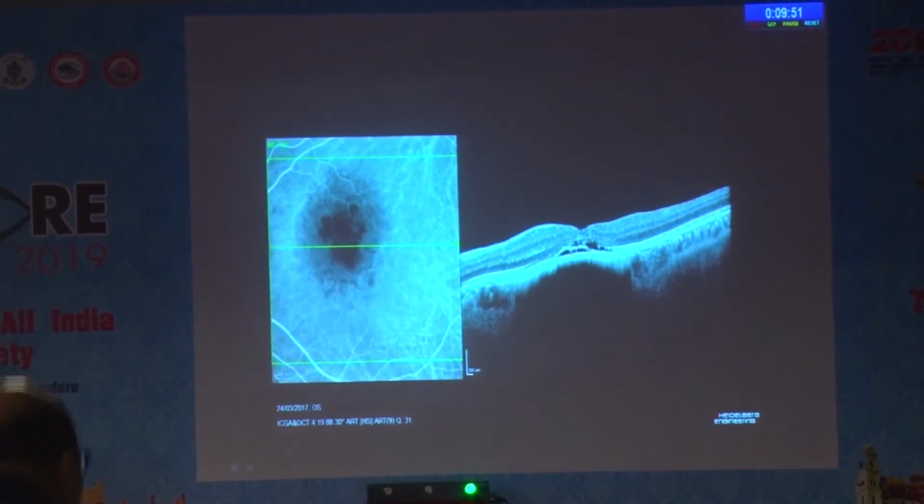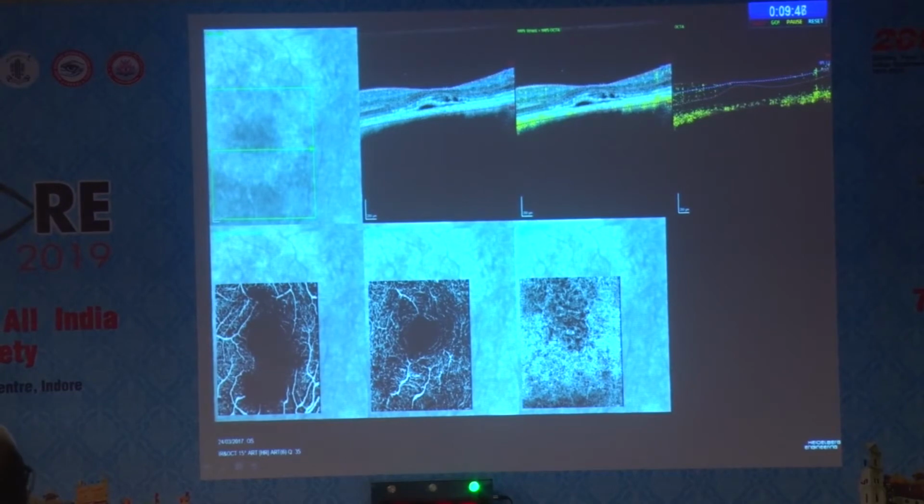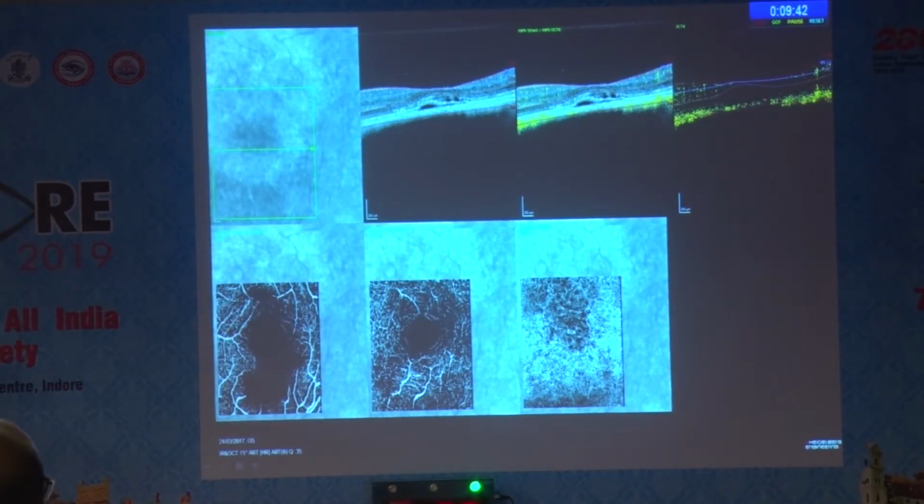Okay. But I just like to look for a conventional fluorescein angiography. Let's see if I have it. No, fine. I don't have it. I have this. So what do we see here? The rise, please.